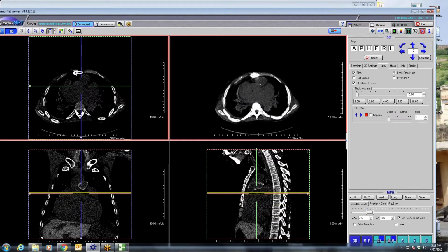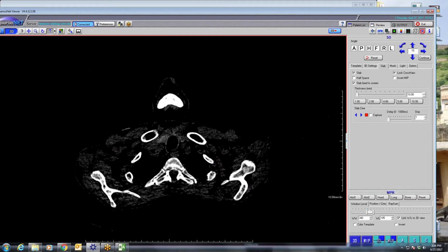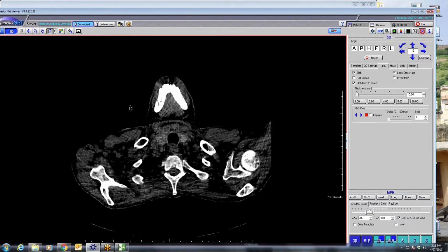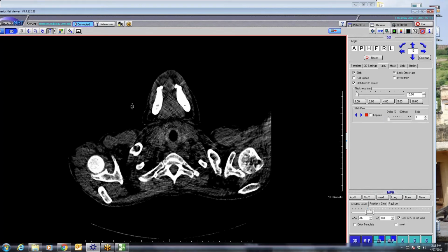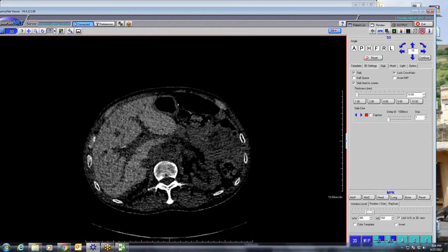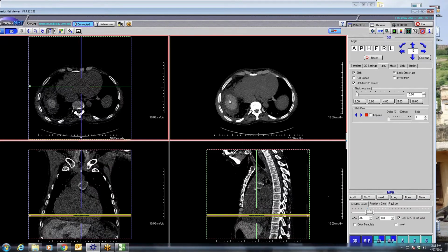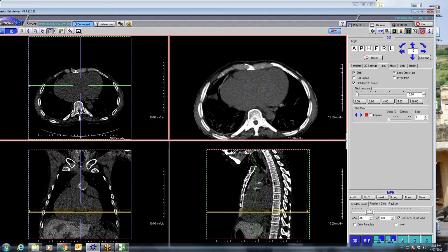Hey, so Seth, check out his thyroid. Yep. Pretty dense too. Does it concentrate in the thyroid as well? It takes up iodine. Yep. Okay. Hey, I'm glad you brought up the question though of the high attenuation consolidation, because I had one this morning. A lady just recently started on amiodarone, and she has very high attenuation lower lobes, and it was mostly atelectasis, but I never know when to invoke some sort of lung injury because she has dyspnea.